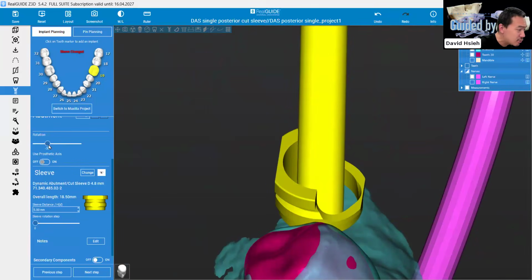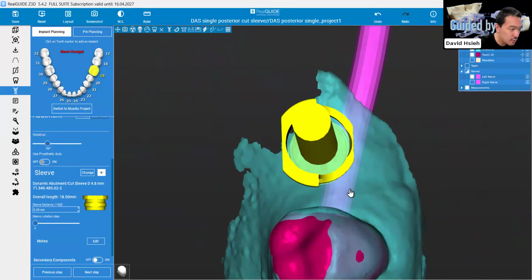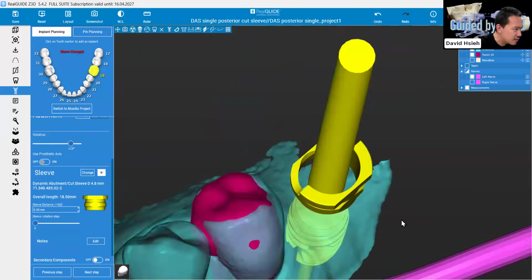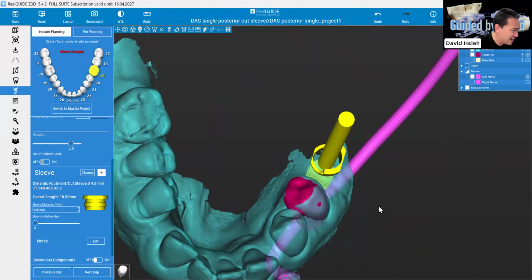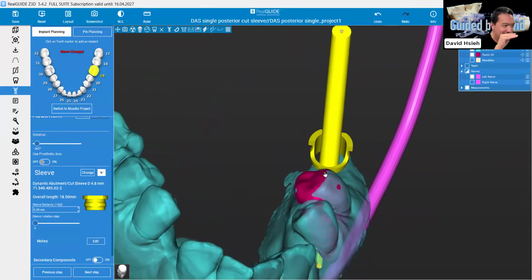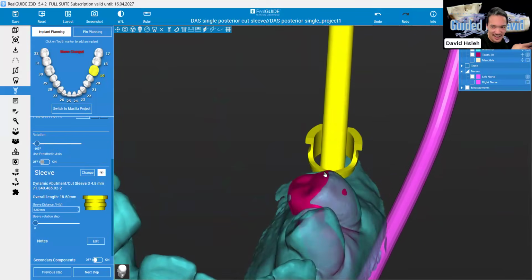So now you can rotate your lateral access either from the buccal. Usually this is what a doctor likes to do, or you can still place it in the lingual if you would, right? The lingual side is another way for the drill to fit in if that's easier, depending on whether you're left-handed or right-handed, or you can put it in the back, or you can put it in the front also, to give you a better chance to fit right in from outside of the mouth.